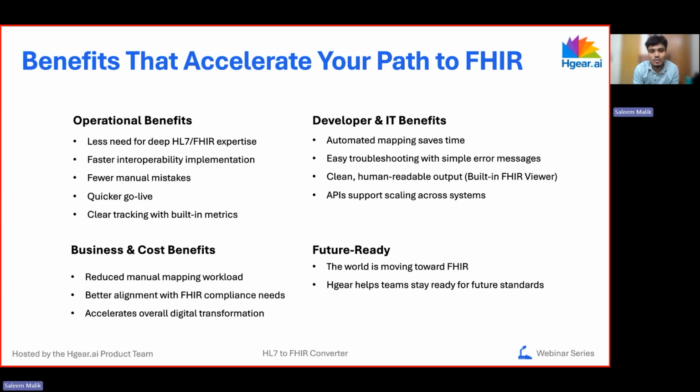Maybe you may be a technical or non-technical person, but if you are using HGear's HL7 to FHIR converter, within a click, you are going to see the patient data in a clean, human-readable format. So that is going to help your operational activity a lot, and faster interoperability implementation. So you don't need to wait for mapping to get completed. You don't need to wait for the system to get integrated. It's fast, it's secured. It's just a click away to see your HL7 data getting converted into FHIR resources.